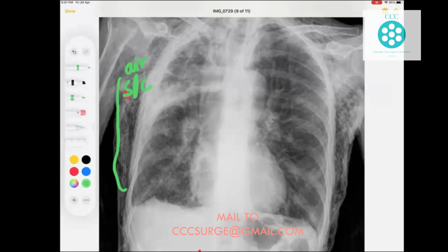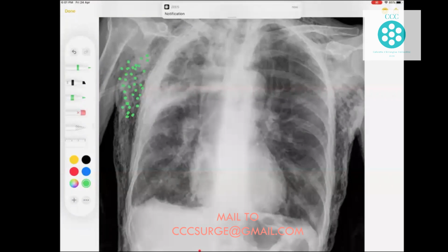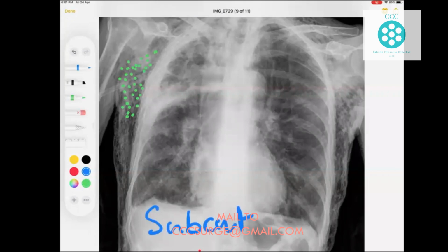I had to take these beautiful pictures from the internet, multiple sites, and I am really grateful for the contribution. Now, these are again multiple air pockets in these soft tissues, and this condition is called subcutaneous, or surgical, both of them are the same, emphysema.